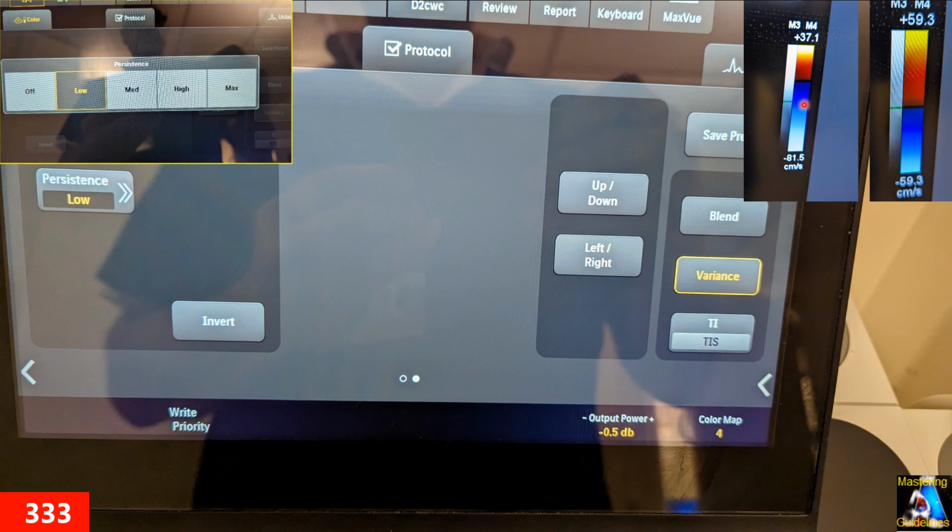For example, if we move the baseline up toward the positive, the machine's PRF for positive decreases and the PRF for the negative shift increases. So it can change the size of the jet and all those measurements. That is the only reason we use baseline changes, for measuring the radius of the jet. Otherwise, we have to make sure our baseline is always at the zero level.